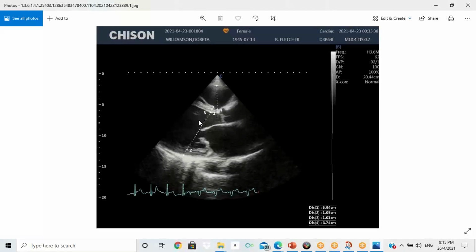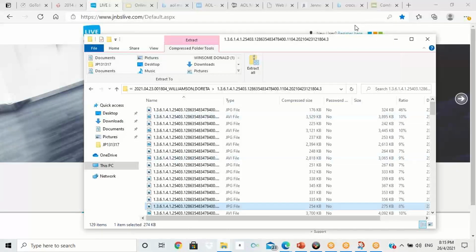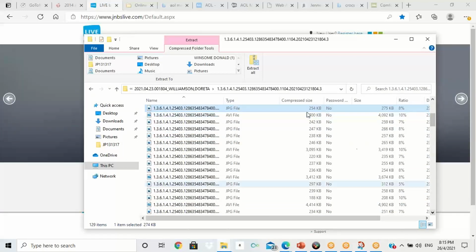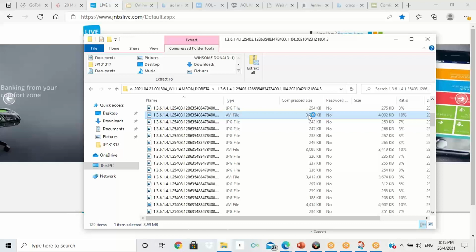All right, so again, you need to remember how you do your measurement. The tip of the mitral leaflet in diastole, where the mitral valve is open, the aortic valve is closed, and you measure the septal thickness, LV cavity size in diastole, and the posterior wall thickness. And you need to know what's normal. Okay. So that's one of the things you have to know as well. What's the normal figure. So when you have an abnormal number or figure, you can identify that.